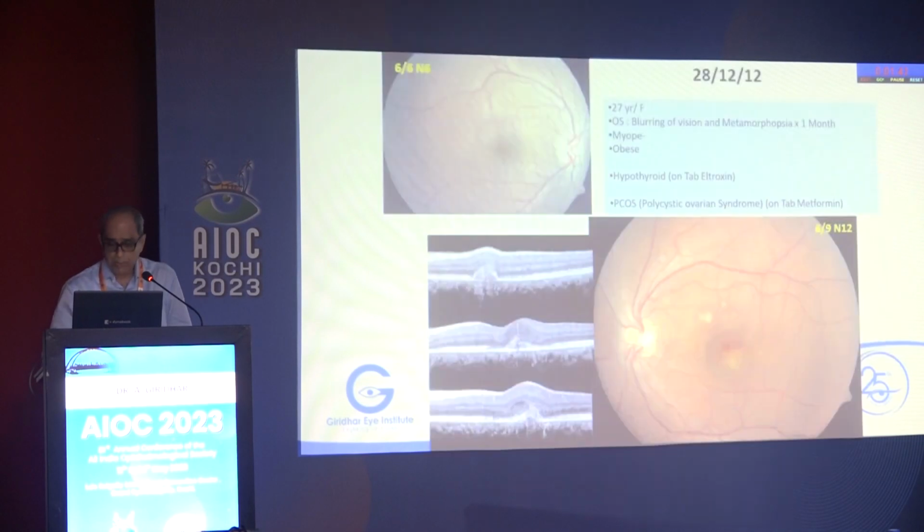Now, if you see this patient, you can see small multiple yellowish lesions, isn't it? And if you see very carefully, you can also see a little bit of fluid and also something red in color. Now, if you do the OCT, you see how diagnosis has improved nowadays. So, you see the OCT. What are you seeing in the OCT?